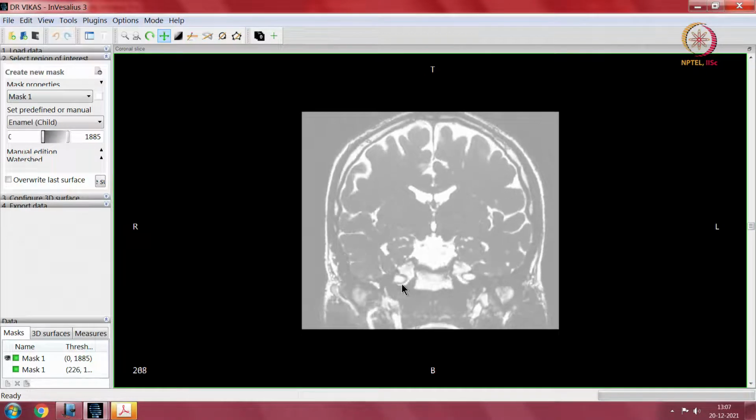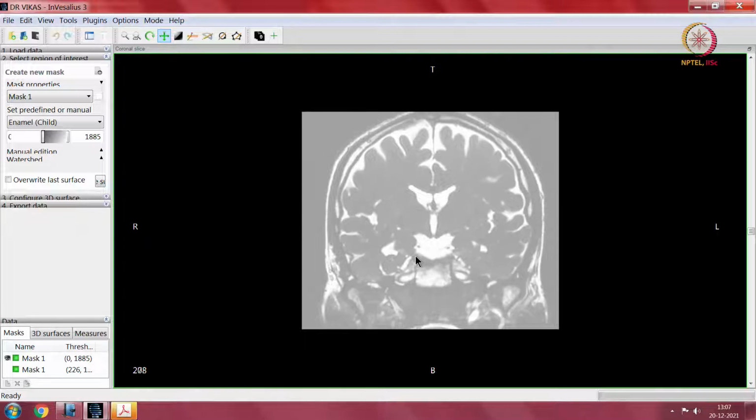So, this structure you see here with a lot of bumps, that is the hippocampus. The hippocampus is on this side, which is the medial part of the temporal lobe. Medial is towards the midline, so this would form the uncus. If this is the uncus and temporal lobe, then this is the temporal horn. Again, going back, this is the lateral ventricle, third ventricle, temporal horn.